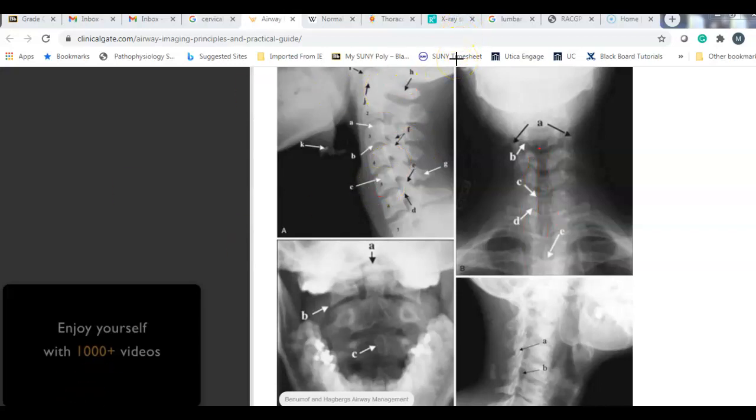You cannot diagnose a herniated disc or soft tissue issues really from an x-ray. You really need to have that MRI or the CAT scan, but you could see the quote unquote shadows of them, right? So you could see this is a pretty good space in here. That's getting a little bit decreased, maybe some issues. Okay, and I'll show you on other x-rays. You could get a decrease of that cartilaginous space. So cartilage. And then soft tissue.